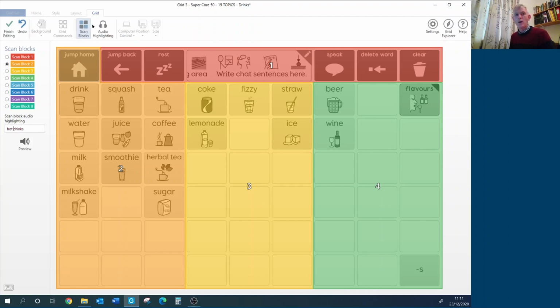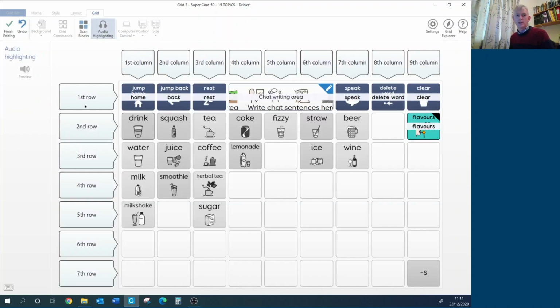And in the same way, you can also customize the labels for the different rows. So you can click in any of these text boxes and replace the label first row with a row that says actions row. Second row could be cold drinks, hot drinks, milk drinks, etc.